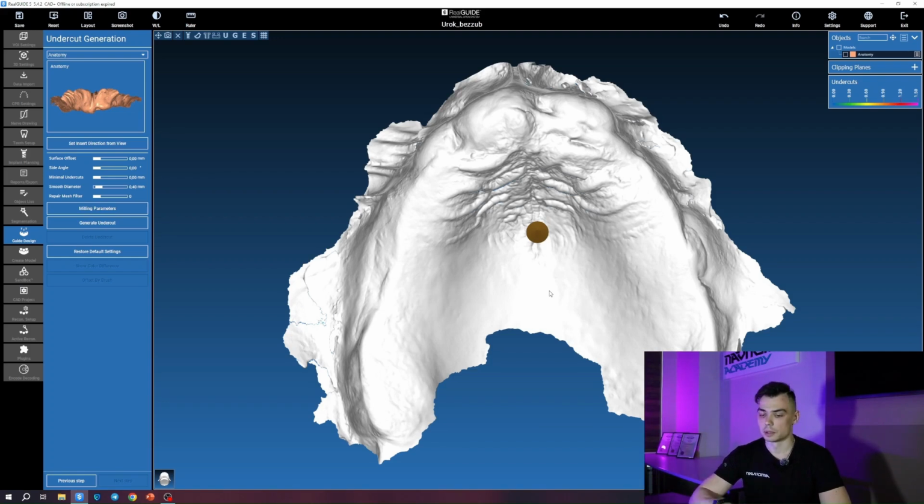The method that we are about to demonstrate was developed by me in particular, and we have further refined it within our team at Navitomia. So essentially, the method consists of making a special radiopaque template for an edentulous jaw, or if there are 4 or fewer teeth, or if there is a metal ceramic bridge with a lot of artifacts.